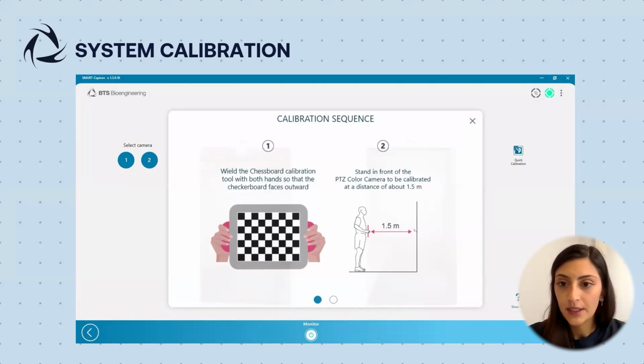So here's a video showing the calibration, which is quick and easy. The calibration routine is a series of actions and commands that must be executed to align and synchronize the cameras and the platform. It allows to measure the distances, the angles, and the orientation of the cameras, and to generate a coordinate system.